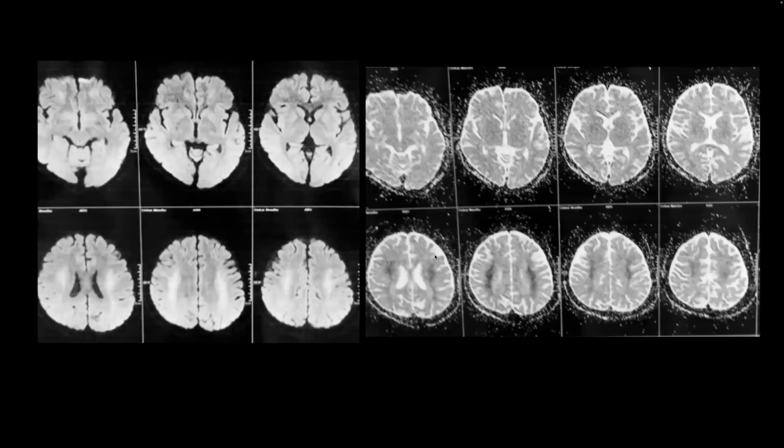The scans to follow. Yeah, so these are from the images, slightly slanted, but we have the diffusion on the left and the ADC on the right, and the abnormalities that stand out are areas of restricted diffusion in the deep white matter extending up to the subcortical white matter, predominantly in the midfrontal regions and also in the parietal lobes. I cannot appreciate anything in the central regions, the deep brain nuclei or the cortex. So based on these images, I'm seeing predominant involvement of the deep and superficial frontal and parietal white matter.